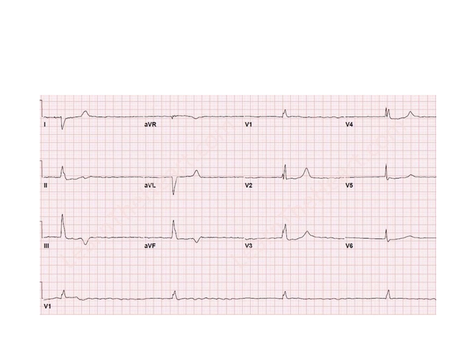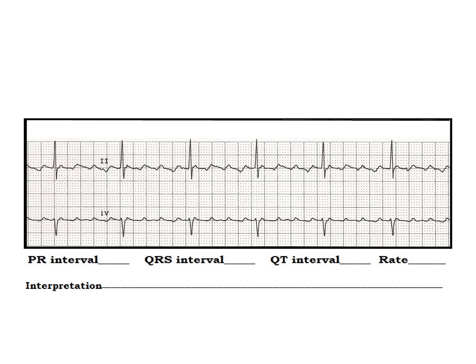So if we look at this particular EKG, we see there is only 4 QRSs in the entire ECG, so the rate is only 24. There is no discernible P waves. The rate is irregular. Therefore, this is some kind of atrial fibrillation. This might be easier to recognize. It's simply a case of slow atrial flutter. So instead of those irregular wigglies around the baseline, we can see distinct flutter waves.